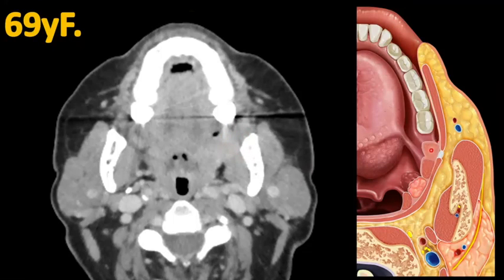It grows northwards along the pterygomandibular raphe, which is the insertion site of the buccinator muscle. So it actually will grow upwards along the pterygomandibular raphe, and then it can grow outwards along the buccinator muscle, as well as wanting to grow medially towards the palatoglossus. This is our palatoglossus, which is our anterior tonsillar pillar, and of course the tonsil immediately posterior to it.